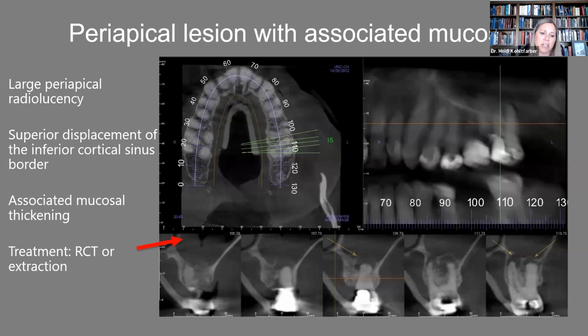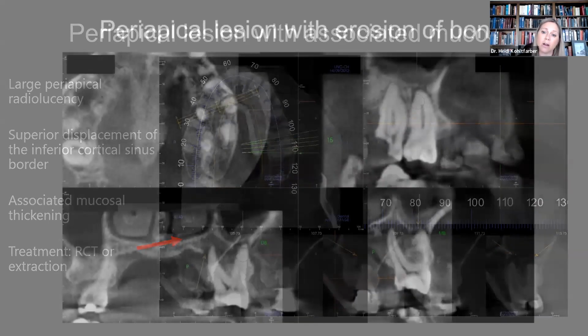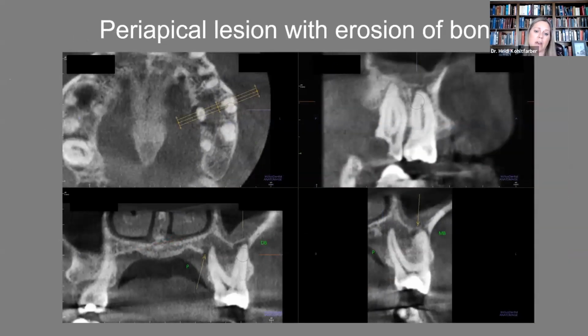But obviously this patient needs root canal treatment or extraction, and as dentists, we are really good at figuring out what to do with that. When we send these things back, of course, we'll say vitality testing to corroborate the radiographic findings, because legally that's what we have to say. But of course, looking at that, that is a ginormous lesion. We need to do something about that.